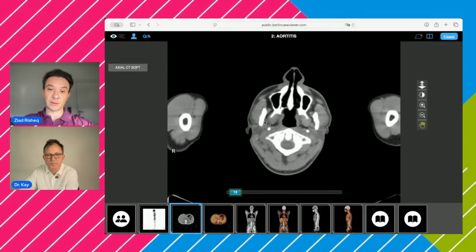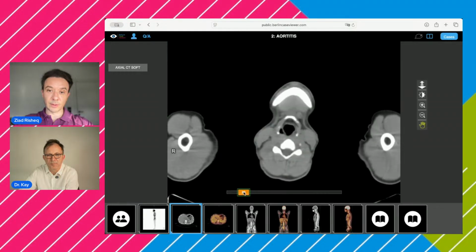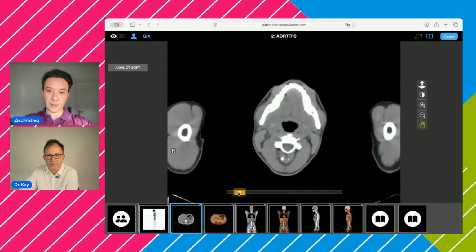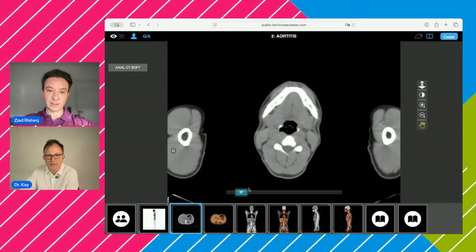So you should think that there is salivary gland involvement. If you have asymmetry on CT between the submandibular glands, or asymmetrical heterogeneity, you should think of involvement in the disease. But basically, you have to assess them on the CT part.